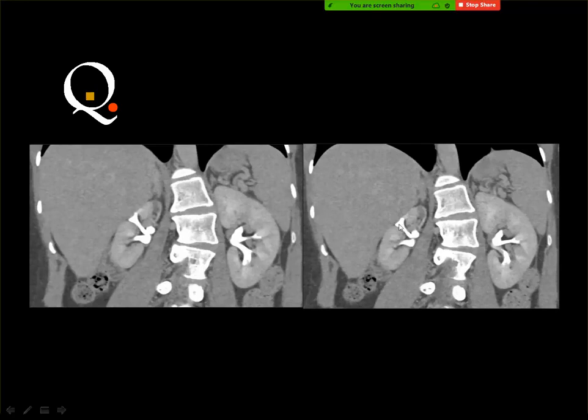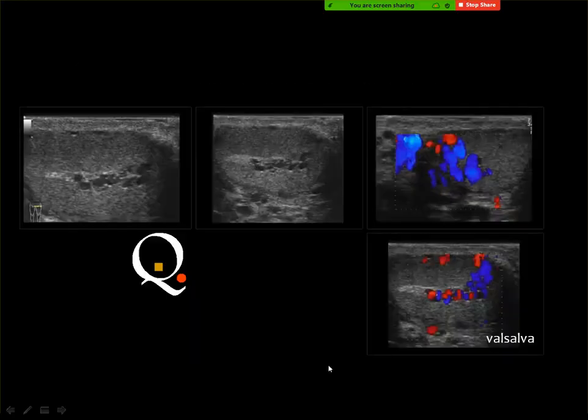This is an important landmark where you can see the calyx reaching the cortex of the kidney, and this means that there is total loss of the renal parenchyma covering the calyx, and this is one of the diagnostic clues for chronic pyelonephritic kidney. The pyelonephritic kidney is small in size, but it excretes the contrast material in a more or less normal pattern. And this is chronic pyelonephritis. What do you think?